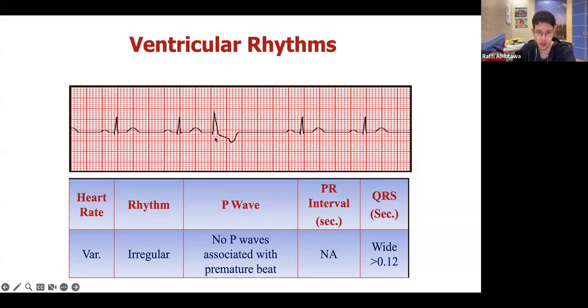Wait a minute. What is this doing here? There's no P wave. QRS is wide. I know it doesn't show too clearly, but the QRS is wide. So just trust me, bro. And as a result, it's causing everything to be abnormal. So this T wave is going to look abnormal. You did correctly point that out. Takes a break, goes back to normal. So there's normal sinus, except for this point. So if there's an abnormality in the background of normal sinus, this is most likely a premature contraction. And then because of the morphology, because the QRS is wide, this is a premature ventricular contraction.